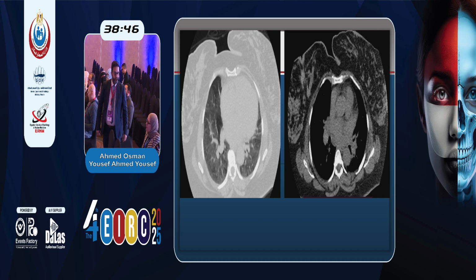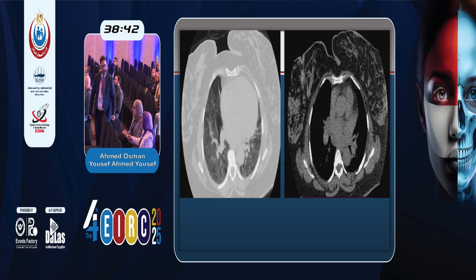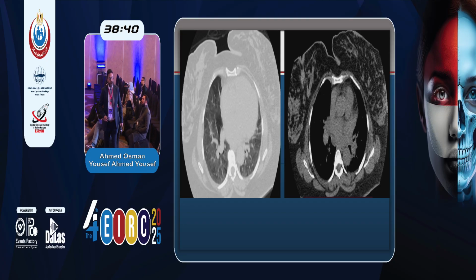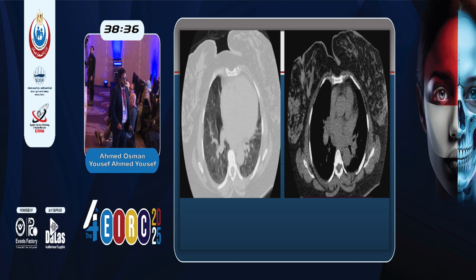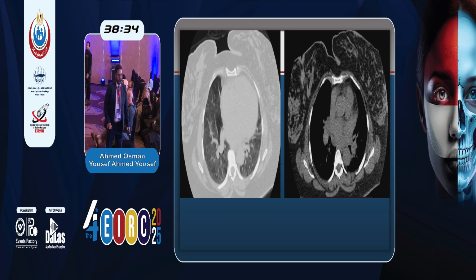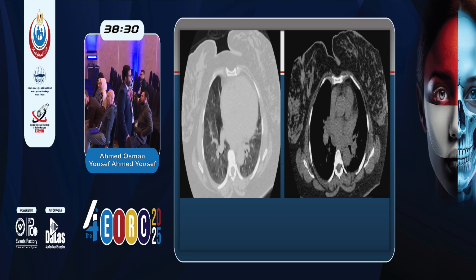There are higher lymph nodes, suspicion of sarcoidosis. Okay, it's better to judge lymph nodes on a contrast CT, with non-contrast CT you will not be confident of the finding. Okay, let's... anybody?